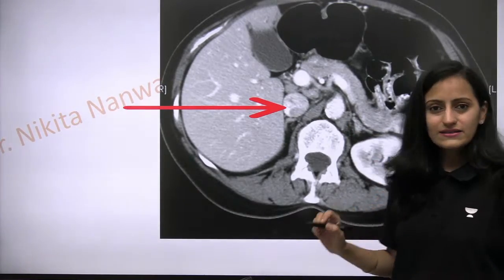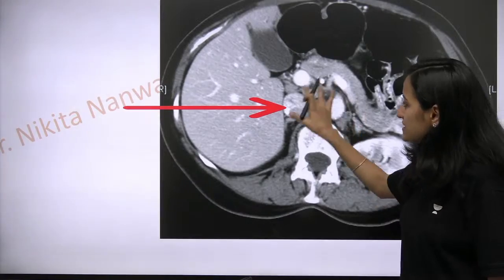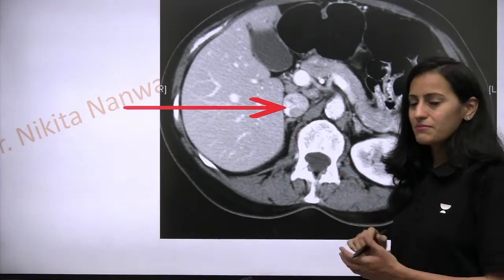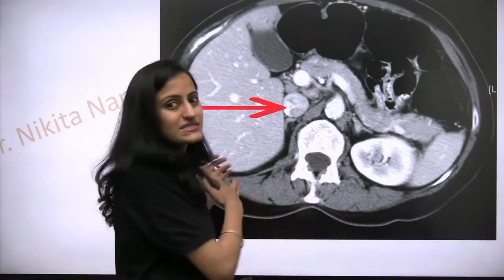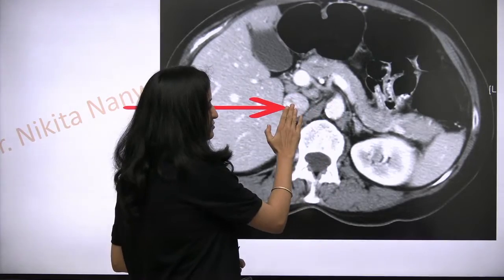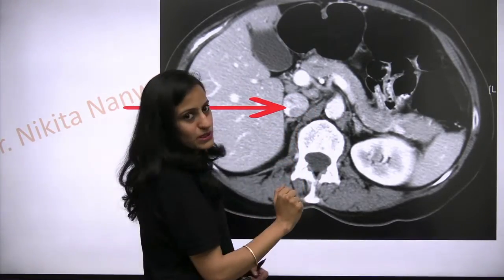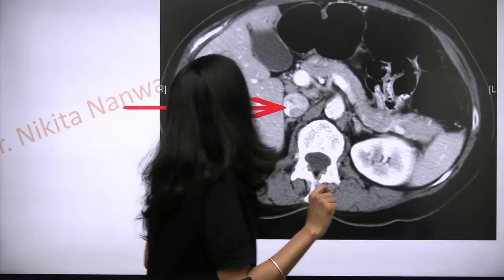Now, is this the gallbladder, is this the IVC, what is it? To the right of the aorta, right? Remember that this is your left, but basically this is the patient's right side. In radiological images, it's the opposite. So to the right of the aorta, in front of the vertebra, we have the IVC. It's not the gallbladder. Where is the gallbladder?